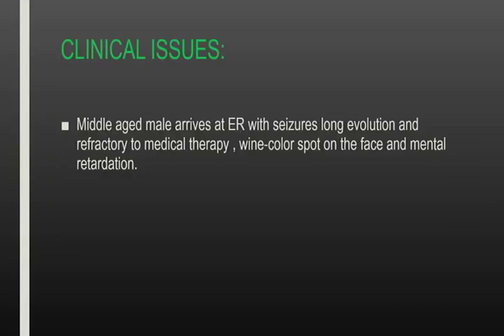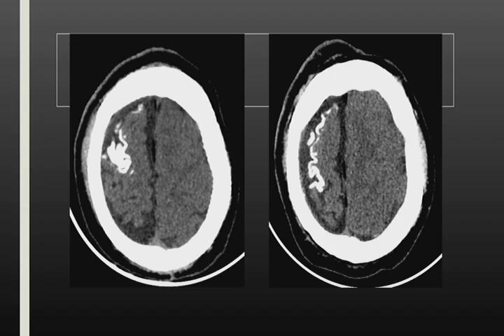Okay, our clinical case is a middle-aged male presenting with seizures, long evolution, and refractory to medical therapy. A port-wine stain is present on the face, and mental retardation. It was decided to make a CT scan, and the CT detects subcortical calcifications.